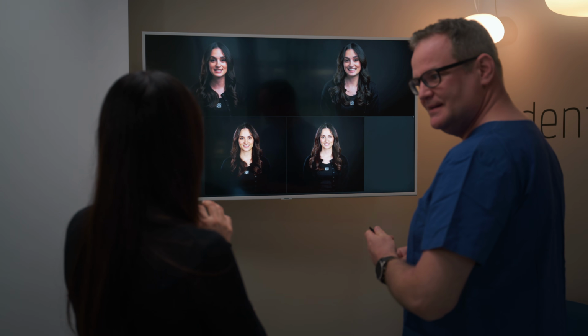and patient. Focusing early on design not only boosts our treatment planning, it also considerably improves our communication with the patient. We can show them a clear visual promise that we will keep, so our designs and mock-ups are a precise representation of the expected outcomes. Now let's break those 5 steps down and go through a complete treatment together.